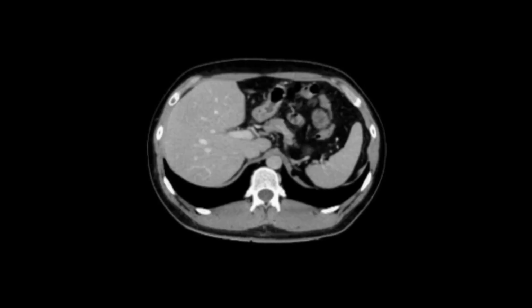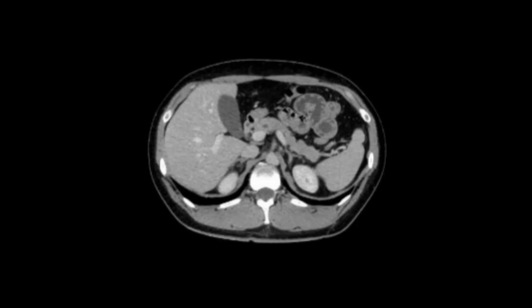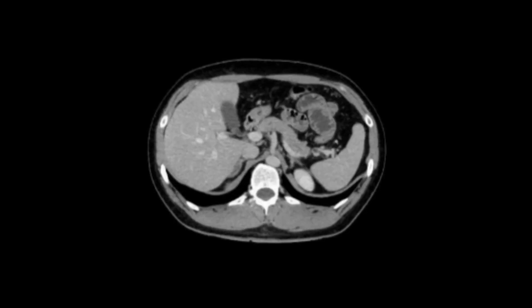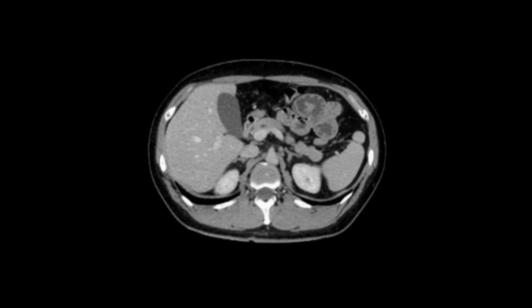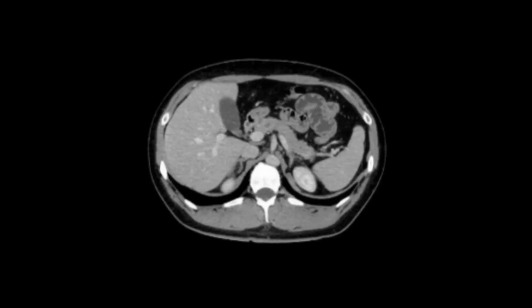Normally, as you see, the liver has very close contact to the diaphragm and to the organs around. The kidney is located just behind here, and this grayish oval-shaped organ which approaches the liver from below is our gallbladder. It is hypointense because it has some fluid and bile inside. That's why we can easily differentiate it on the images.